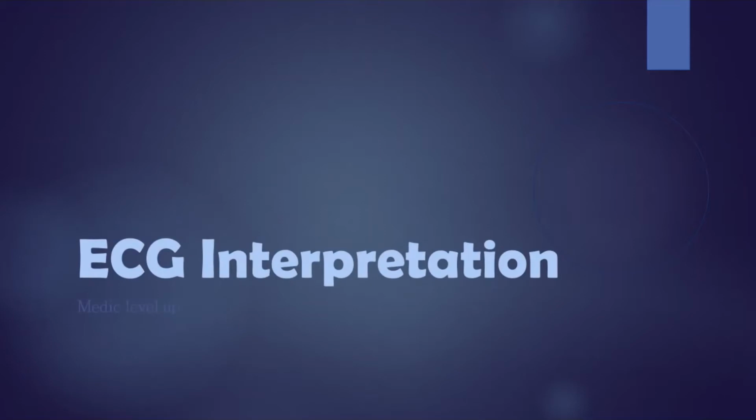Today's video is going to be slightly different. We're going to be doing some ECG interpretation. Let's dive in.